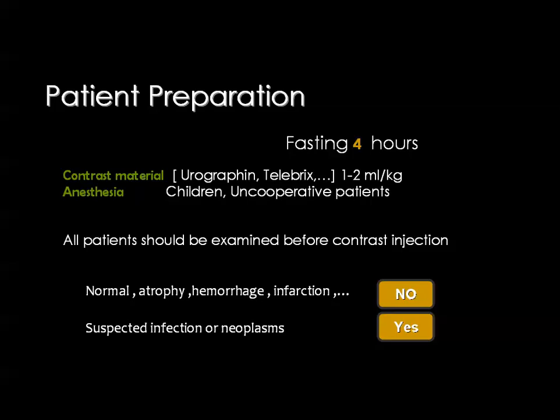And you know that whenever we are going to examine a patient with CT or MRI, there may be some pre-examination preparations. And for the brain, by CT and MRI, we do not need any specific preparation apart from making the patient fasting for about 3 to 4 hours. And this is only indicated whenever we intend to inject the patient with contrast material, or we are going to give him some sedation in order not to move on the machine, disturbing the examination quality.